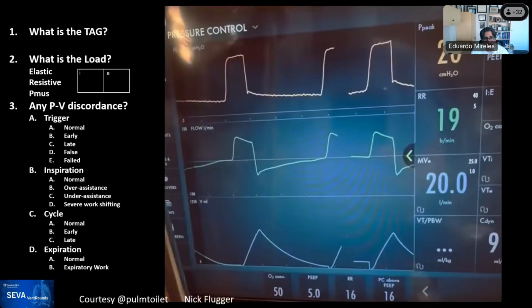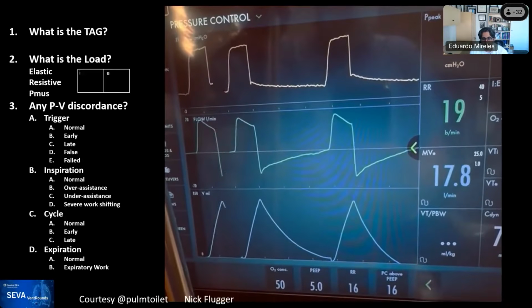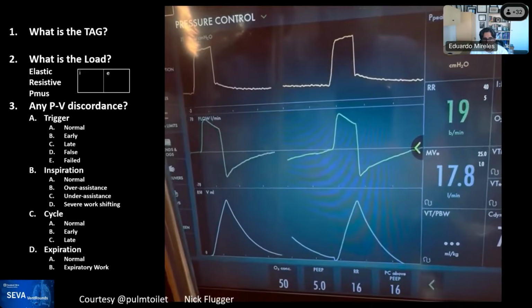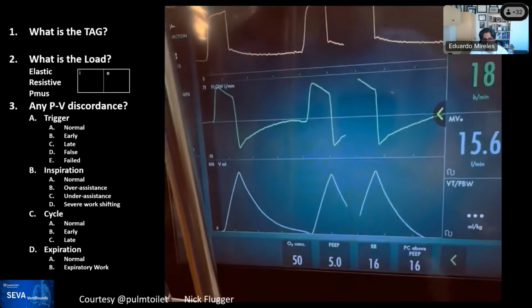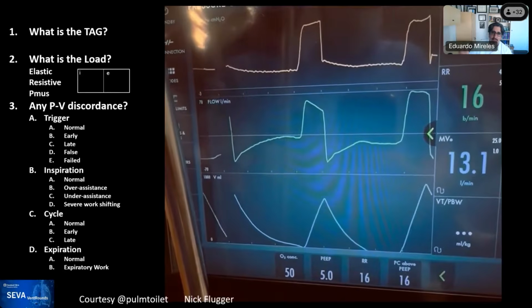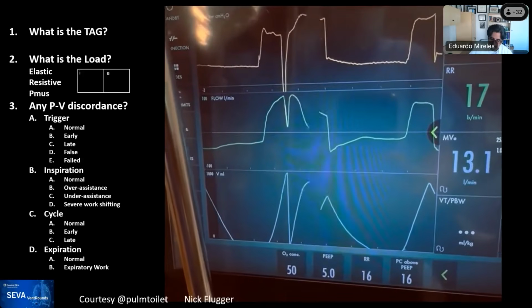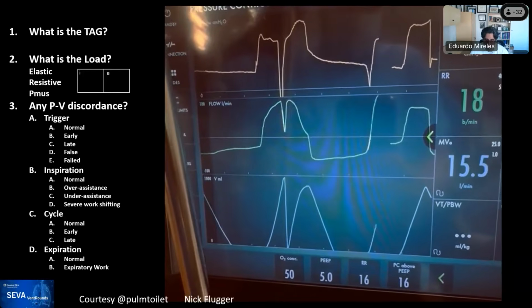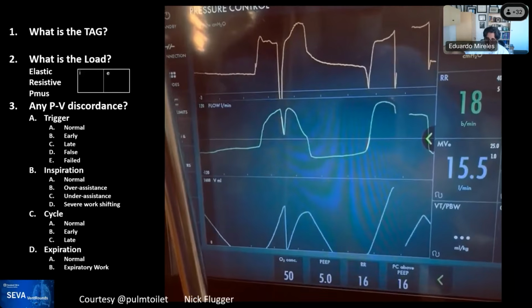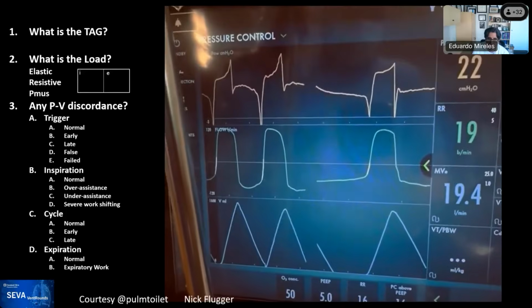That would be an interesting alternative: when the patient starts asking for much, the ventilator decreases support. When it stops doing it, it increases support. That way we try to mimic a mode used in the past, adaptive servo ventilation in the non-invasive world.